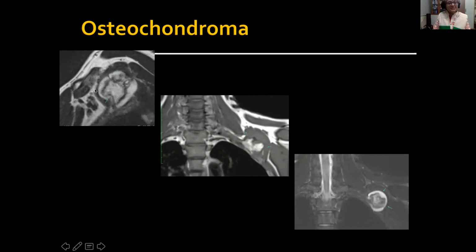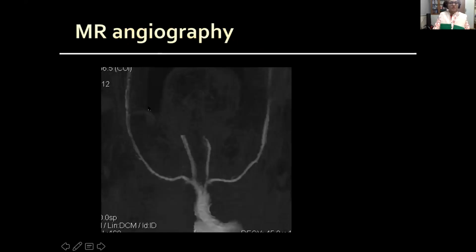Here, this patient had this large osteochondroma, exostosis. You can see from the rib and see how it is compressing. So this was the brachial plexus. So how it is near it in neutral position and in elevation, it was compressing it and had to be operated because of the mass effect it was causing. You can do MR or CT angio with the arm elevated to try to look for obstruction of the artery.